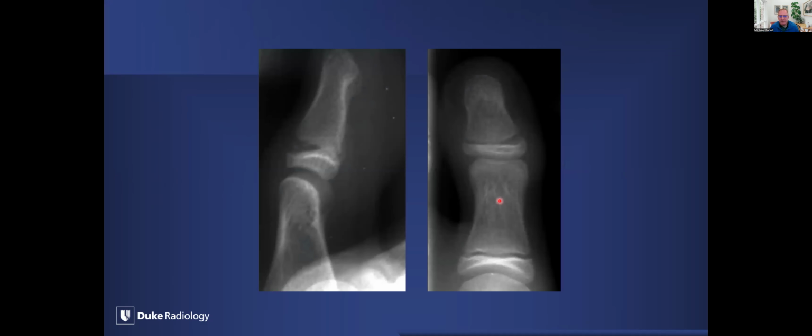Okay, so little toes and fingers. Before we get into this particular fracture, this is my search pattern. Even though we can see those buckle fractures quite easily in the long bones, like the distal radius, like we saw in the example there, or potentially the proximal radius or ulna, and the little fingers and toes, I'm always looking at that transition from the thick cortex to the thin cortex to see that point of weakness. We can pick up on these little buckle fractures.